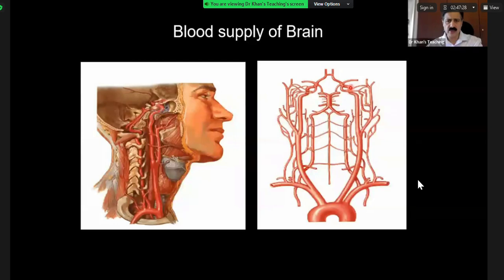Internal carotid goes, and you can imagine that it is passing through the carotid canal and then the supraclinoid portion. Actually, this is the ACA, this is the ACOM. On the other hand, look at the vertebrals. They go like this, and then they join together. For the exam, the key thing to remember is that this is a very rare view because you will only see it on an MRA or a CTA MIP sequence. You will not see it on a DSA for the simple reason that all arteries will never be visualized on a DSA. The medialmost is the vertebral artery. So please remember this. Because an examiner will put this and one of the vertebral arteries might be absent, and if you don't know it, you will not pick it up. And then is the internal carotid, and external carotid is most lateral. So just remember these three positions.